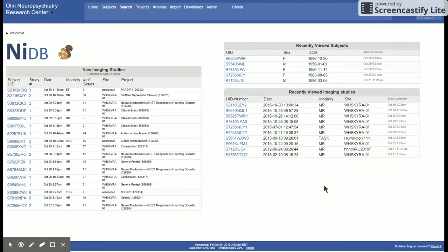All right, welcome to a demonstration of the Neuroinformatics database. This will be an overview of the system. In other videos, we will describe in detail some of the features available.